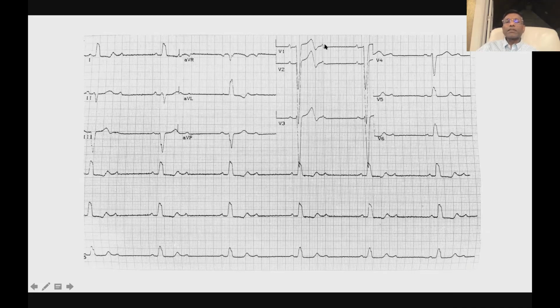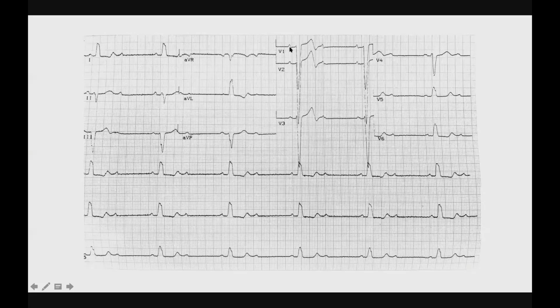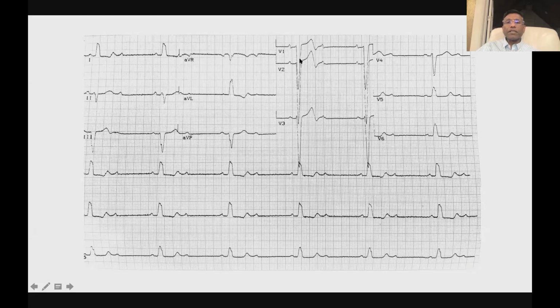But come back here and look at this thing that we call a U wave in the other leads. Doesn't that look suspiciously like the P wave? Yes, exactly. Very good. So basically you had a P conducting down to QRS, P block, P conducting to QRS, P block.